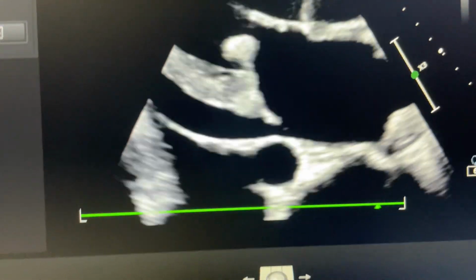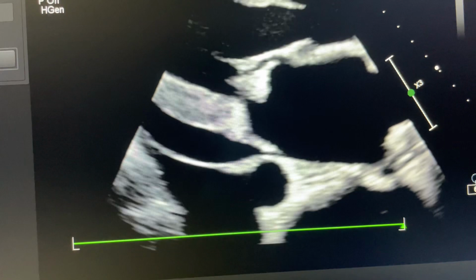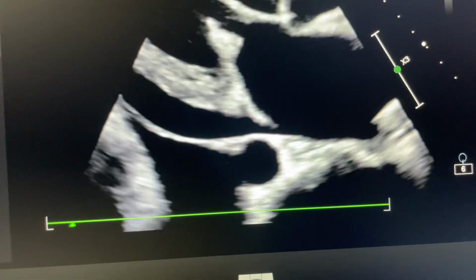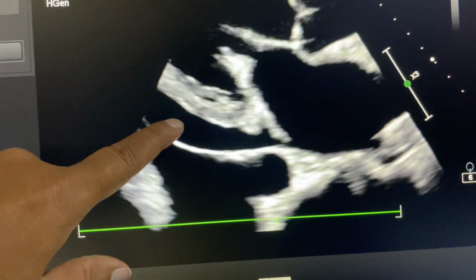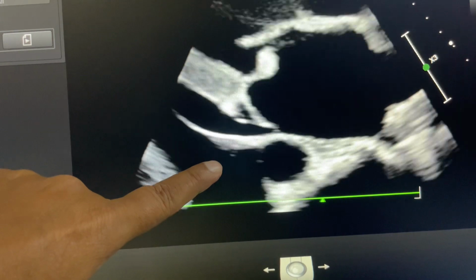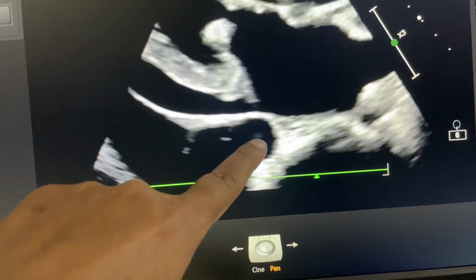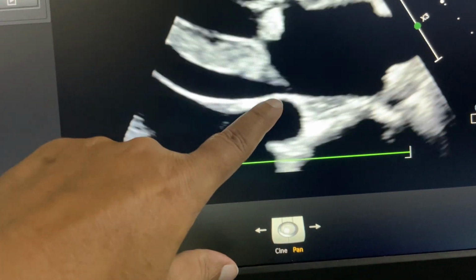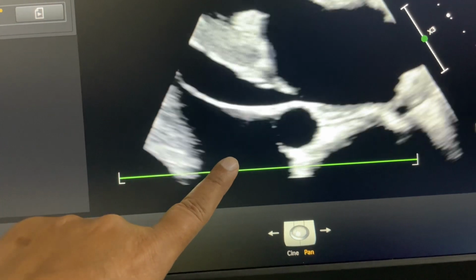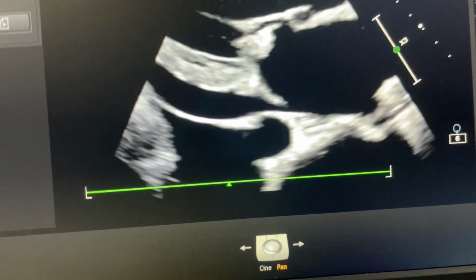In this image you can easily see, next image, this is aorta in short axis, or you see aorta in transverse section. This is pericardial effusion. This is left sided pleural effusion. This is aorta. So aorta in transverse section, effusion posterior to aorta is pleural effusion, anterior to aorta is pericardial effusion.